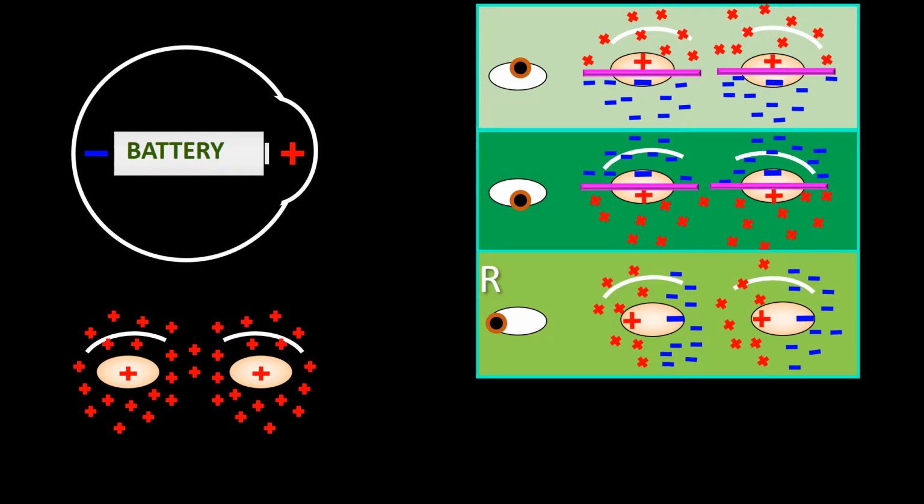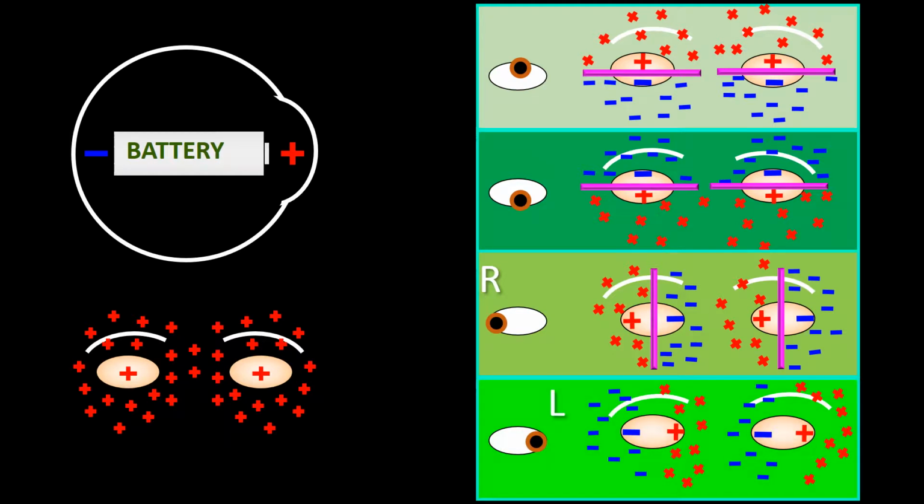When looking to the right, the positivity is to the right in both eyes, each having their independent Greenwich meridian. When looking to the left, the positivity of each eye is to the left. Again, we can use the Greenwich meridian analogy to separate the positive and the negative field in each eye.